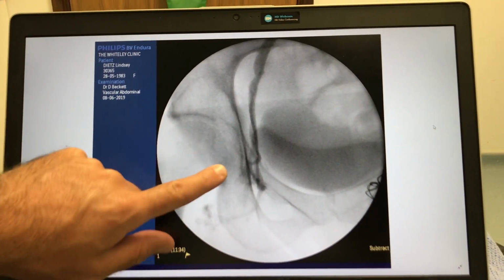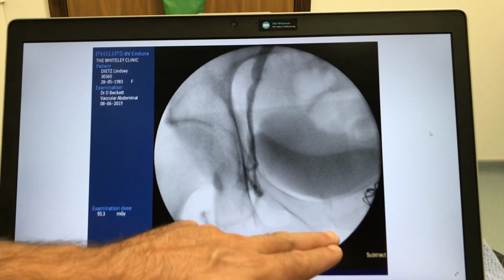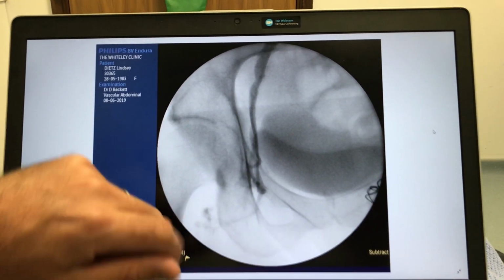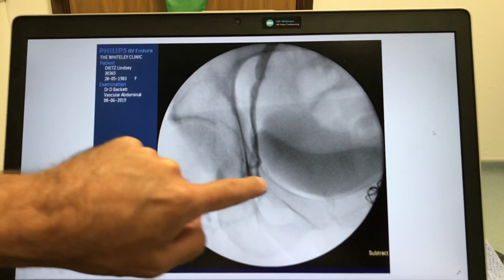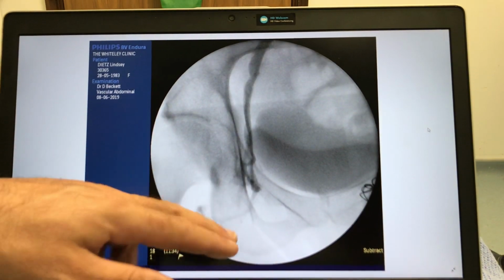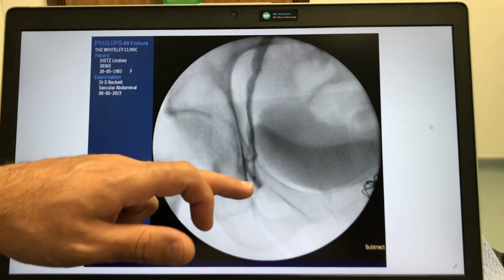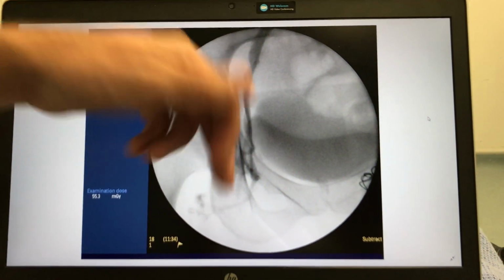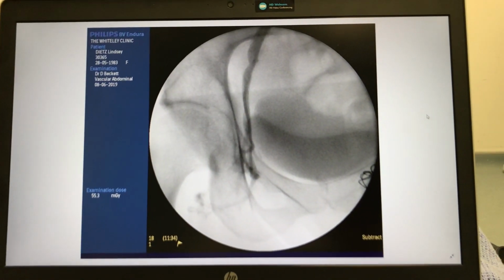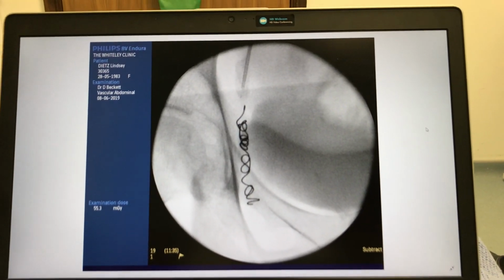So you can see your hip at the side here. You can see this is your bladder sat within the pelvis. Remember, your vulval veins are going to be in this region here, okay? This again is coming down to this area where you see a little hole in the hip, or pelvis rather. So this is called your obturator foramen, and because of that, this is your obturator vein, okay? So it goes into it. Yeah, exactly. And we know that on the scan was refluxing, okay? So then we've got a coil sat in it, and that's blocked now, okay?